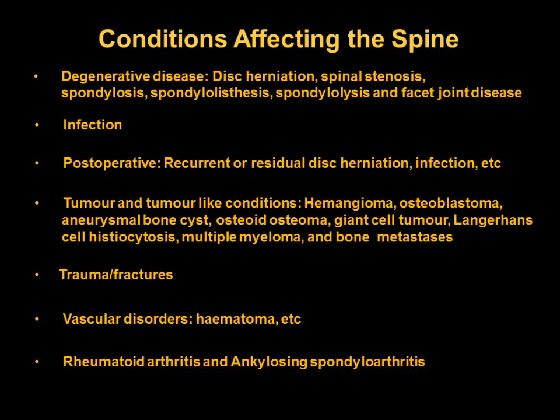So whenever you're describing a pathology, you need to relate it to an anatomy. If you're talking about the patella, tracking, lateral tracking, is it lateral or medial? Because it guides the surgeons whether they do a release operation on the lateral side or the medial side. Same with the spine.